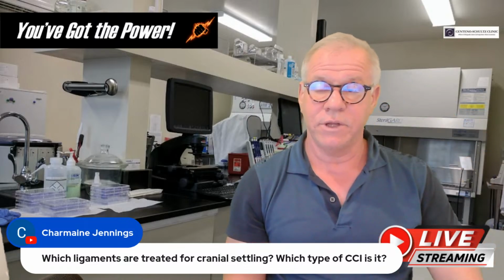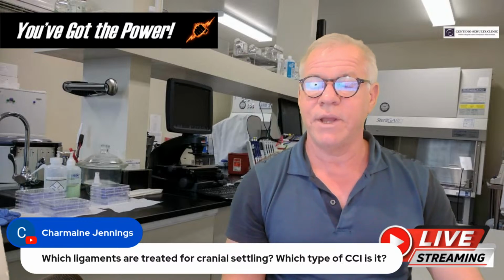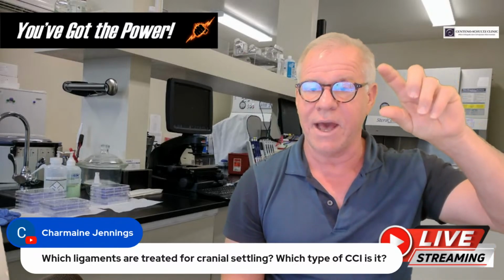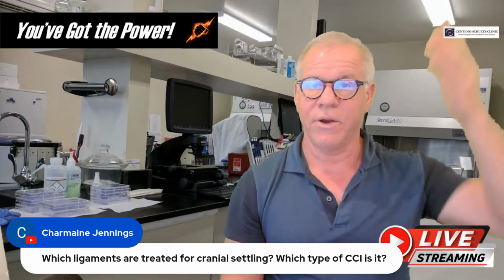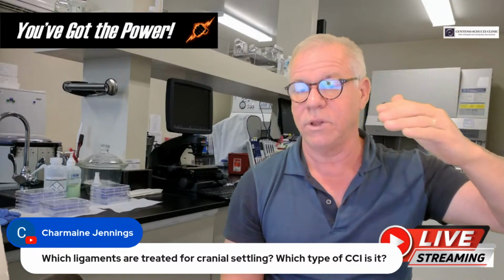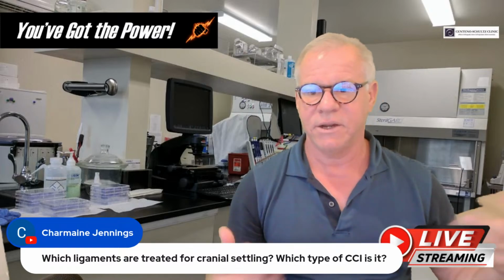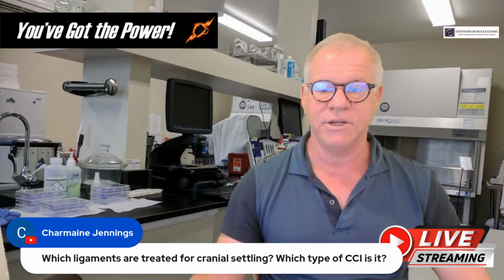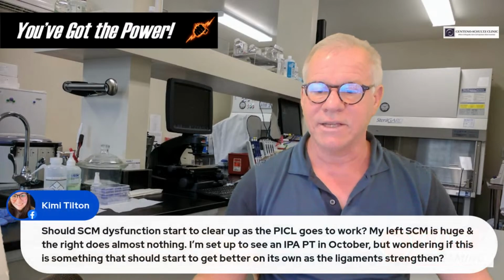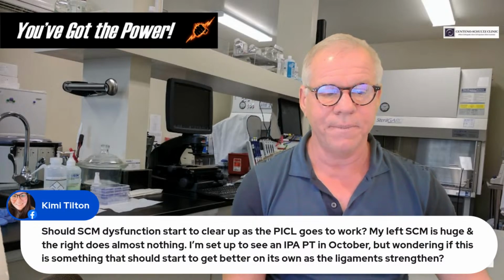That's where the term comes from. The question, I think, would be in situations where you have a lower BDI, basion-dens interval. Can you get a scenario where the basion becomes so low that it starts to cause symptoms? And I think that's unknown at this point. But if it's occurring in our patient population, it's occurring because of laxity in some of those different ligaments that link back to different types of CCI.